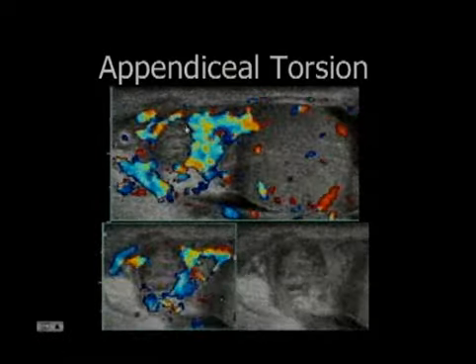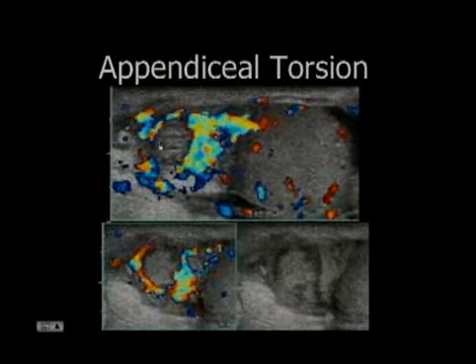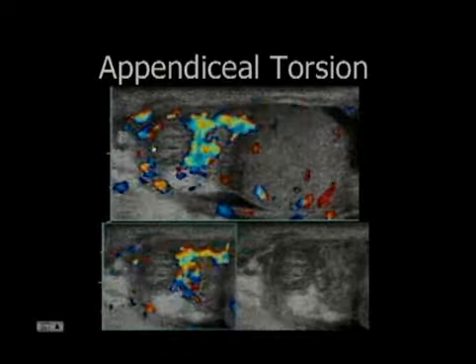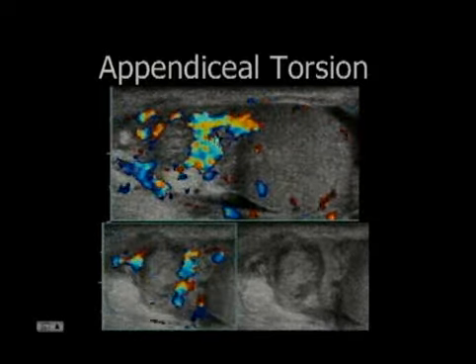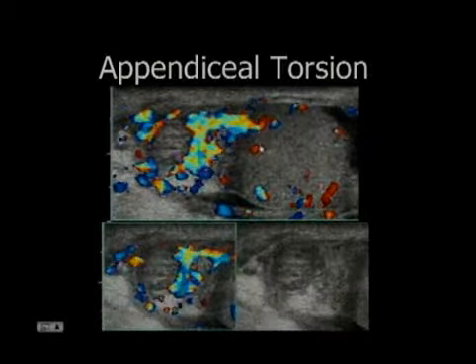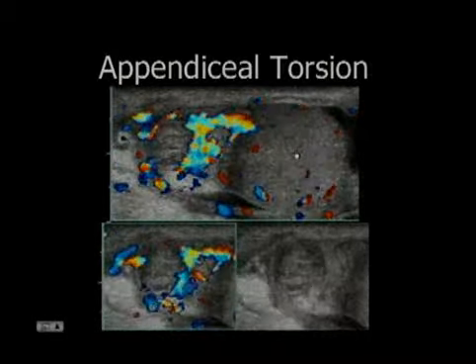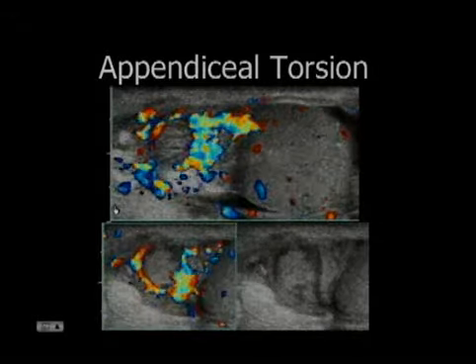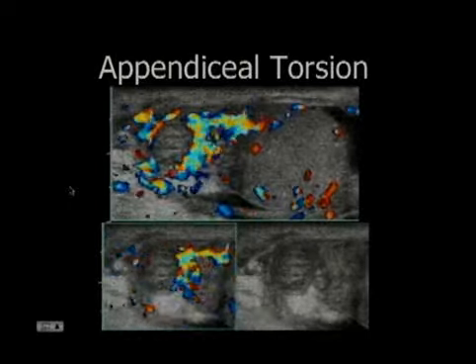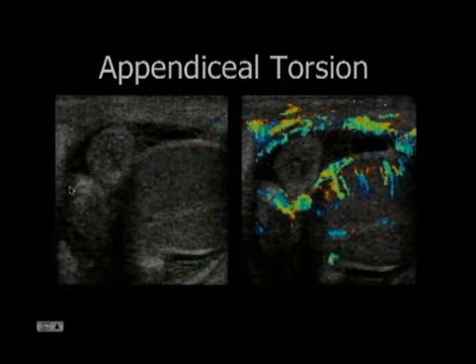So in this particular case, a fairly typical appearance. You can see the torsed appendage. They often have this heterogeneous, described as salt and pepper appearance. They're typically over 5 millimeters with tremendous surrounding hyperemia. There's thickening of the scrotal skin, some dirty hydrocele fluid, and you can even get some associated testicular hyperemia, but tremendous inflammatory response. Most common thing we see in prepubertal males. Most of the time these will go away with just conservative treatment. Occasionally they need to be operated on to remove these.